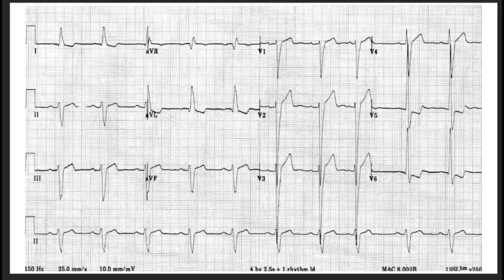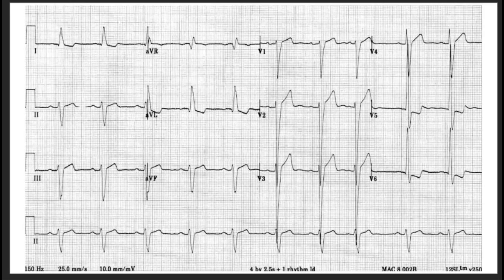So as you can see here, the left ventricular hypertrophy. One way which is easy to remember, because sometimes the waves overlap and you're not sure where they begin and end. So you need to calculate Sokolov's index regardless, but you can see that it's obviously very long and they're overlapping. So when you see overlapping QRS complexes in the precordial leads, you can be sure, okay, this is a left ventricular hypertrophy, and not right, but left ventricular hypertrophy.